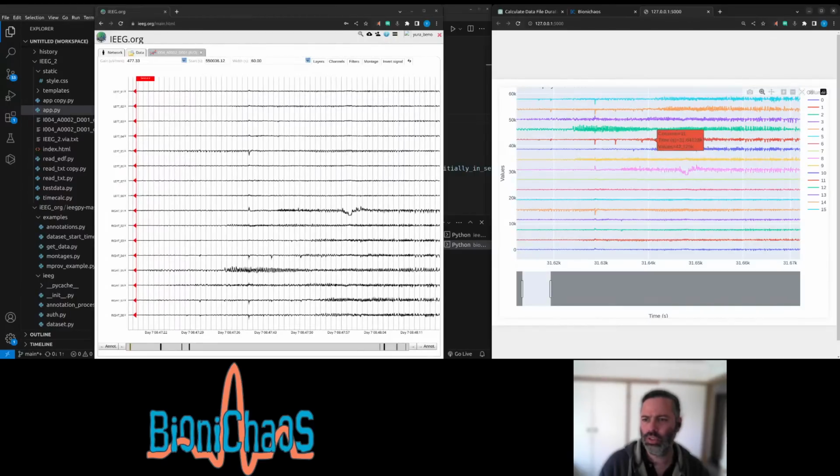It's this one. So it will be 1, 2, 3, 4, 5. The fifth. All right, because this is 0, 1, 2, 3, 4. Yeah, that's correct. So it'd be right of 4. So we have them as right and then left. So they're like reversed.